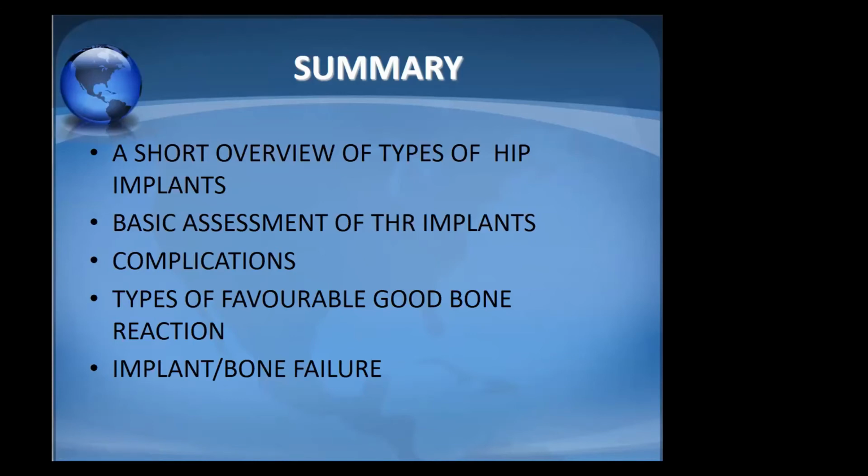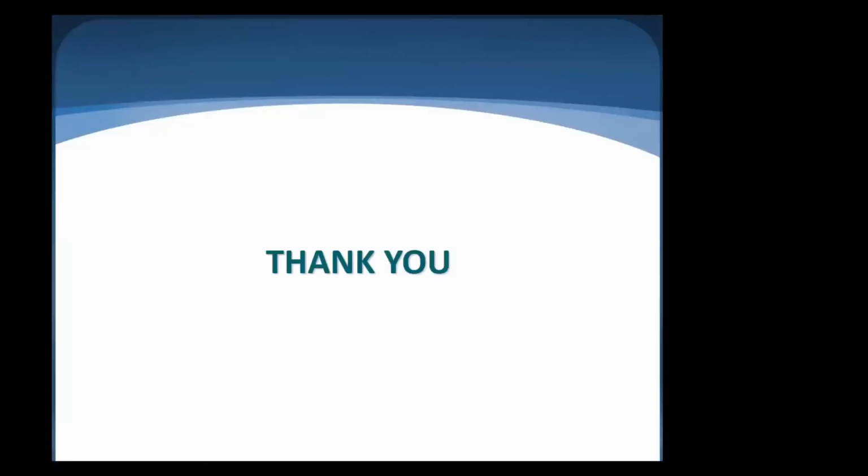failure of metallic implants. Remember the good news of favorable good bone reaction, stress shielding and spot welding that we discussed. And finally, you will have an easy time to comment basically on the dislocations and bone failure, fractures and periprosthetic fractures. That was all for me today. Ask me any questions. I've got, I think, 5 minutes or maybe 7 minutes for questions.